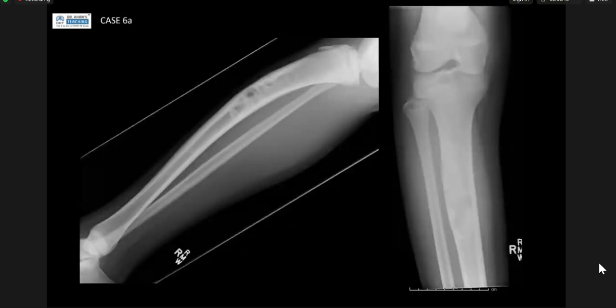I think this is candidate 2. Yeah. So, given the lateral and frontal radiograph of the knee joint and proximal leg, full leg in lateral view of a skeletally immature patient, okay, I see multiple well-defined lucencies in the proximal metadiaphyseal region of the tibia, with sclerotic margins.